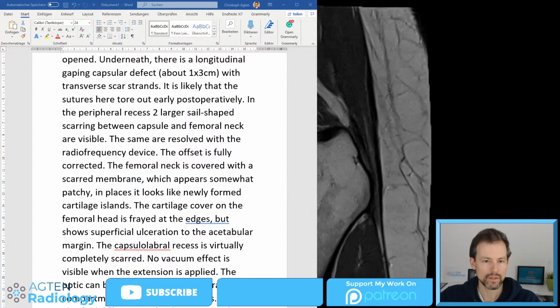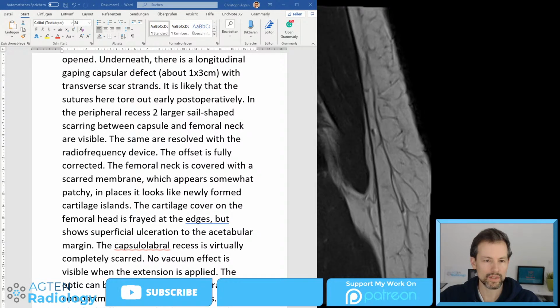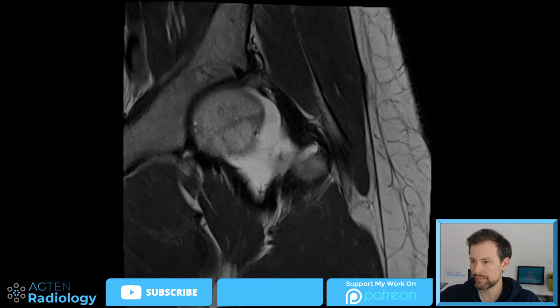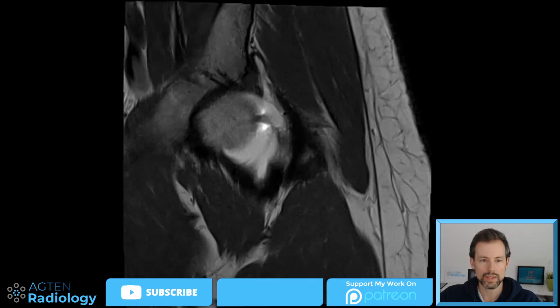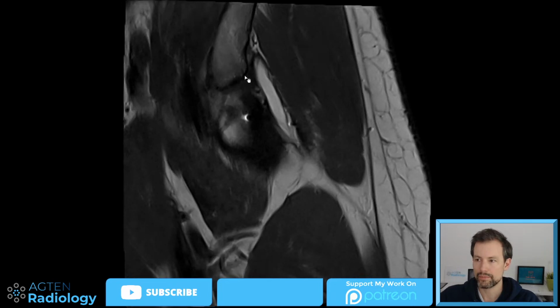So not in the more posterior portions, but up here, everything is completely scarred, and that's what they actually meant with this. It's also a very frequent finding. Oh, again, I'm sorry, this is so stupid. I should probably share a screen rather than windows. So again, completely scarred, that's what we expect, right? All this stuff. This one, okay.